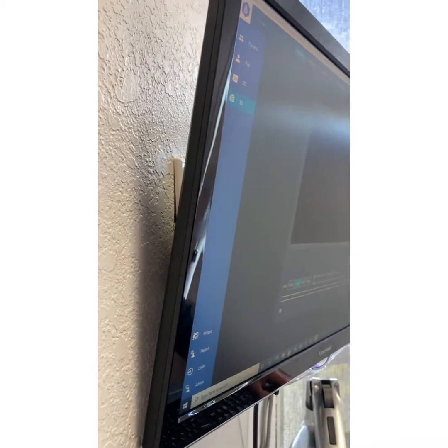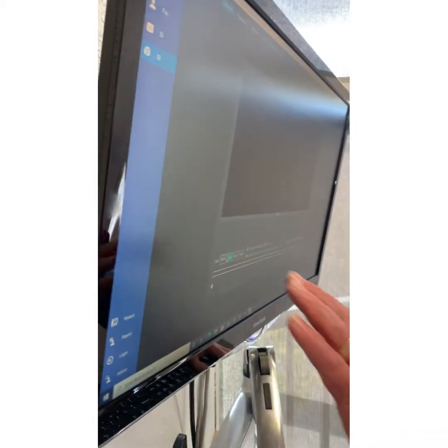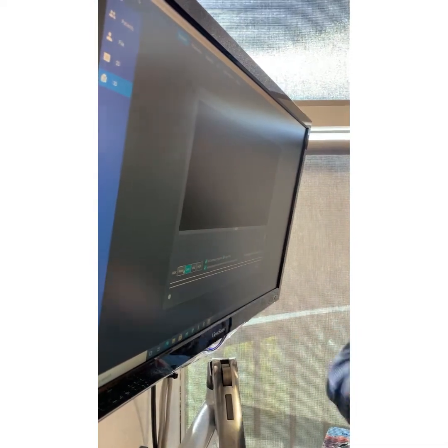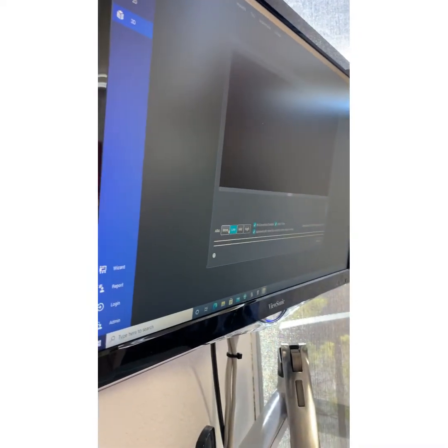One thing that you can't set a default for is your artifact removal algorithm, or ARA. 3D is a little different. When the radiation hits metal, it creates what looks like the Kilz primer that you splash on the wall. That's what it does to the image. So what this does is it reduces or removes it. I don't believe in removal, but it reduces it dramatically so that it doesn't impede what Doc's trying to see.